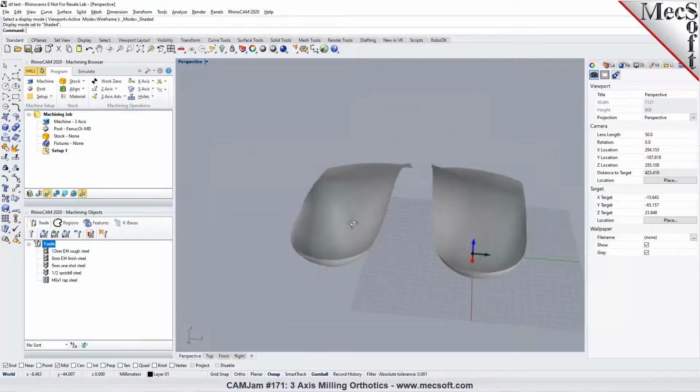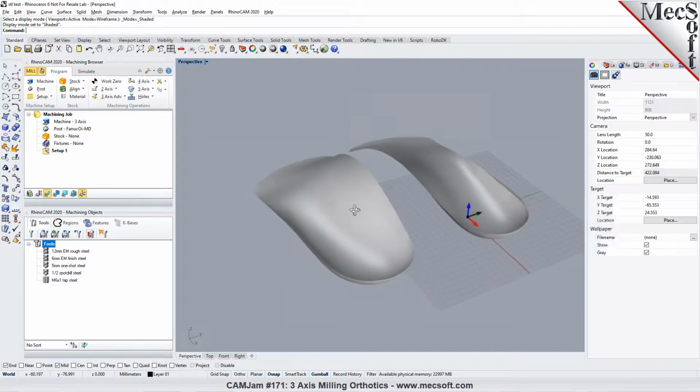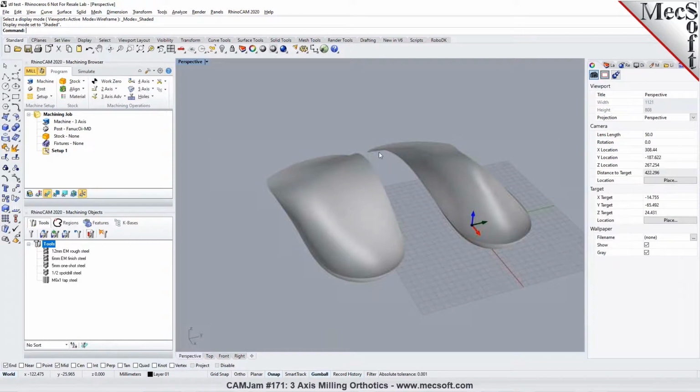As far as machining goes, we'll be machining what we see right here. Now, if you're looking to machine a positive mold of a foot scan, let me see if I have something I can load. I can certainly do that once I show you how we can program a part like this. Then we can take a look at it. Okay. Sounds good. So there are tools in Rhino as well that you can use to build a mold or mold cavity with it. So that's part of the CAD design. But if this is what you imported, we can go and directly machine this part.